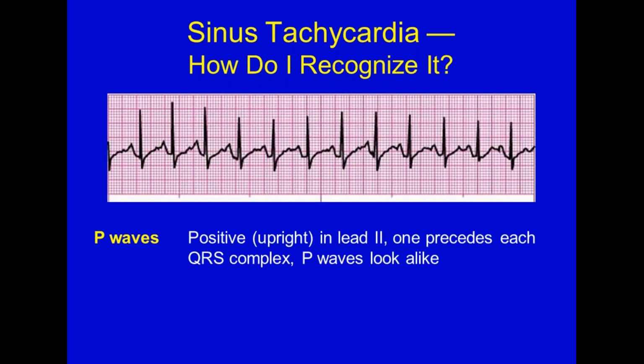Question for you in regards to the time movement for all three of these. Why is the interval not changing if it's more rapid? Because that's the contraction. You said the QRS is going to shrink. The QT is going to shrink. The QT duration will shrink. Okay. It's going faster. So I'm saying after the measurements here, it's still saying the QRS is going to be less than 0.12.